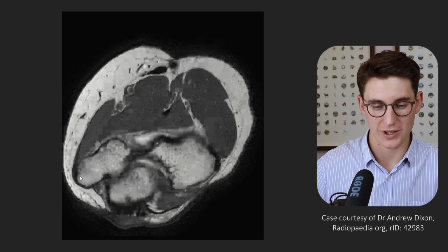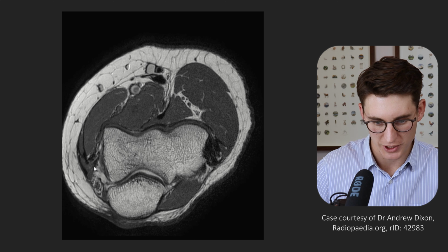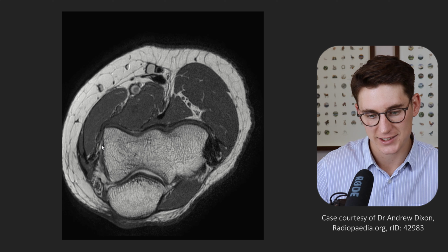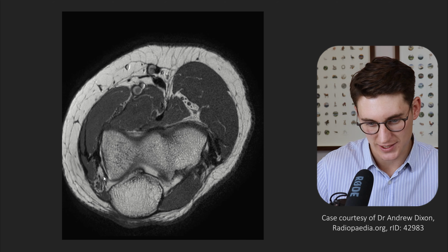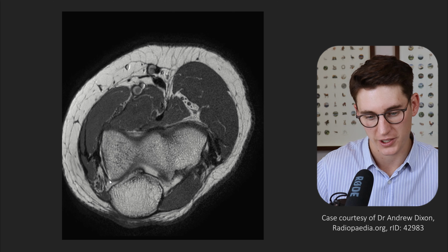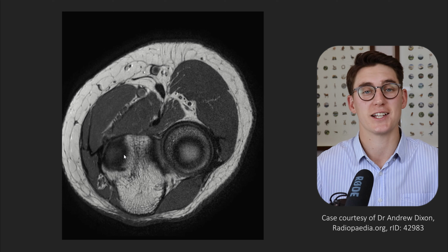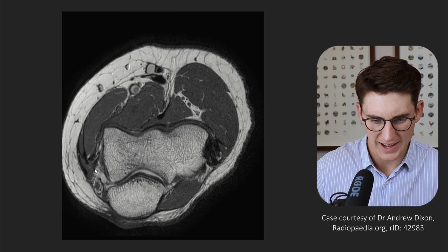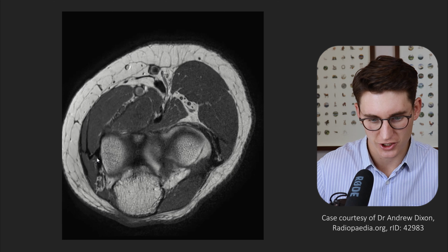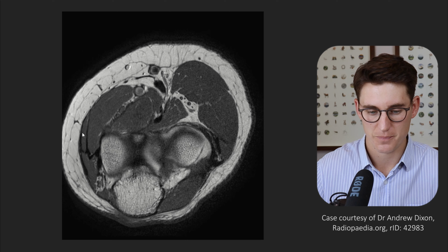Now, if we go to our medial epicondyle here, we can scroll down slowly and we should be able to see here that anterior bundle of our ulnar collateral ligament. And here we can see that thin posterior bundle heading off there. And it's very difficult to see our transverse ligament that heads from that coronoid all the way around to the olecranon. That anterior bundle we know inserts into the sublime tubercle of our coronoid process.